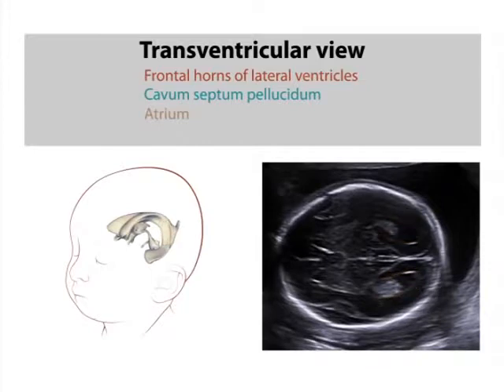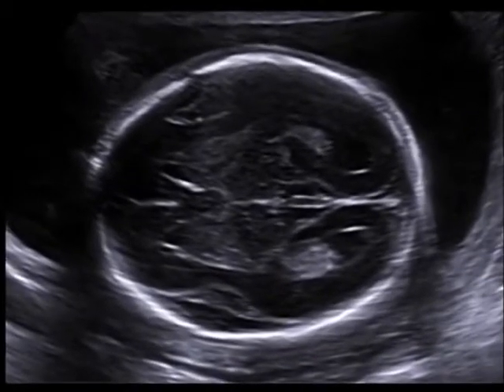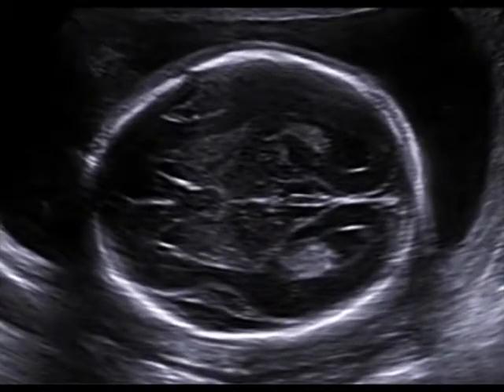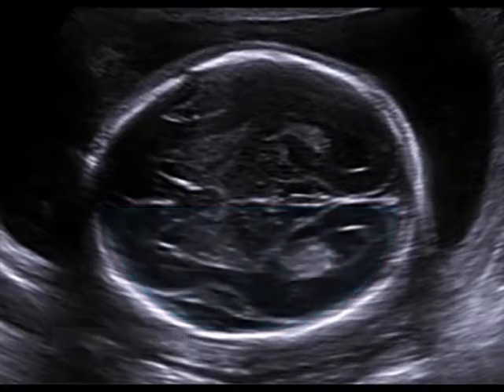In both images, the echogenic choroid plexus fills the lateral ventricle and produces cerebrospinal fluid. The transventricular view is used to evaluate the ventricular system. Typically, only the cerebral hemisphere in the lower or far field is clearly visible sonographically. The choroid plexus is again seen.